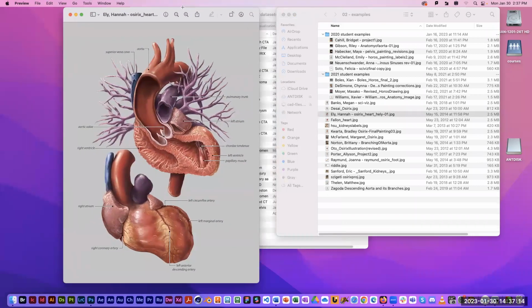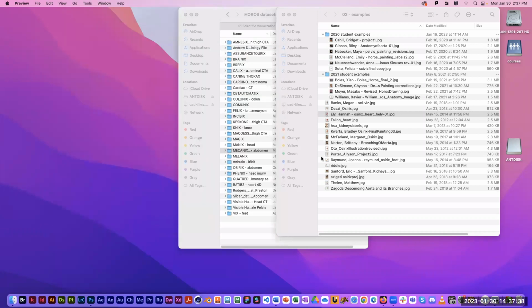So this is an earlier one before I had students add the skin outline, but this is one where this student obviously did a JPEG of the external structures of the heart, and then used the crop tool to cut a coronal section of the heart and exported another JPEG of the cutaway view of the heart. Just a couple more, I'll show you.